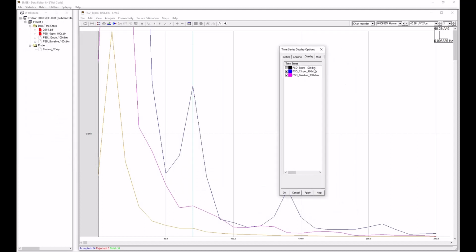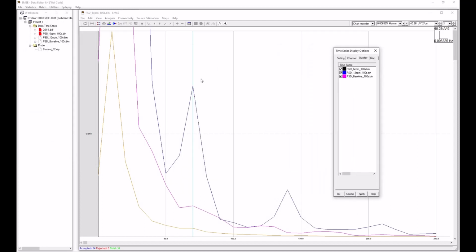We're in the 12 CPM case, has a peak there on the GSR channel. And you might find some interesting correlations, I don't know, between the GSR peaks, skin conductance, and respiration. Anyhow, now it's yours to play with, so I'll leave it at that.